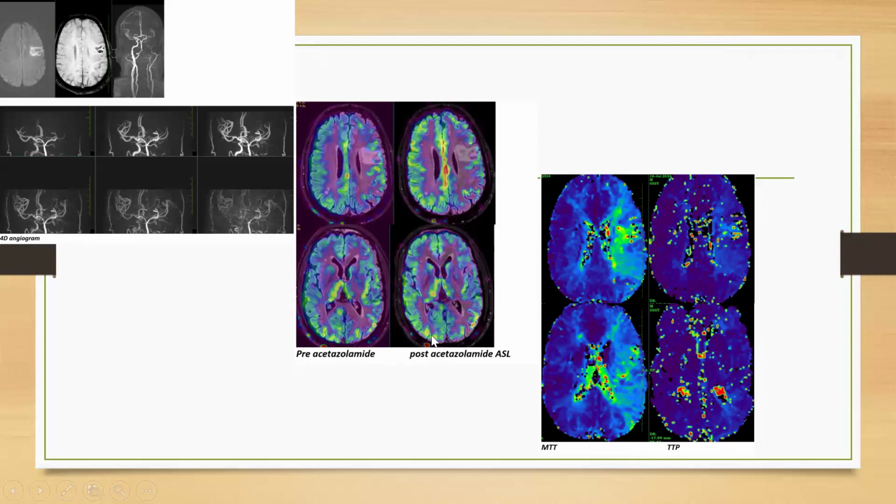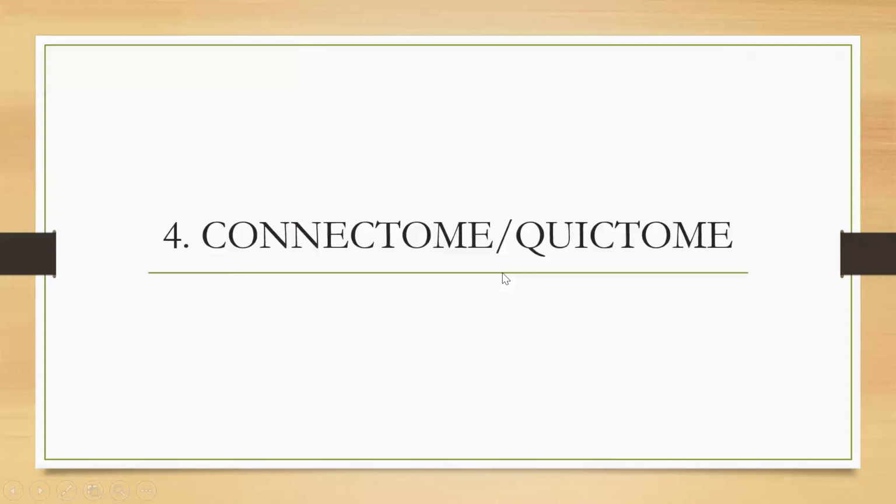It's a normal phenomenon. Whereas in the post-acetazolamide challenge, the left cerebral hemisphere showed some areas are stable, some areas show further reduction. This is a paradoxical response, the type 3 response, and these cases may require bypass procedures.